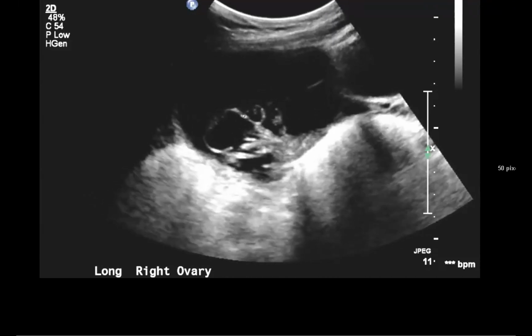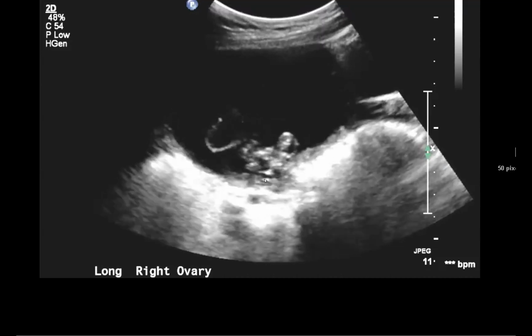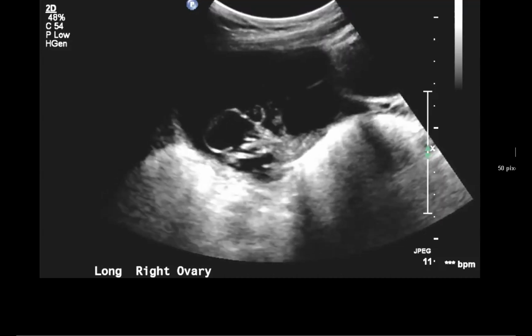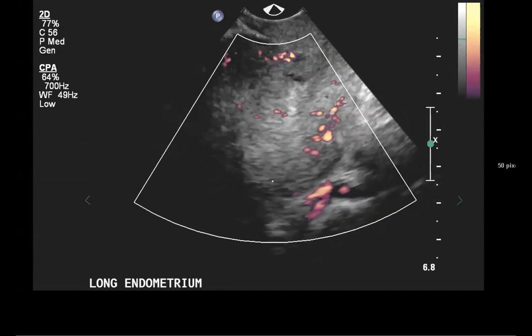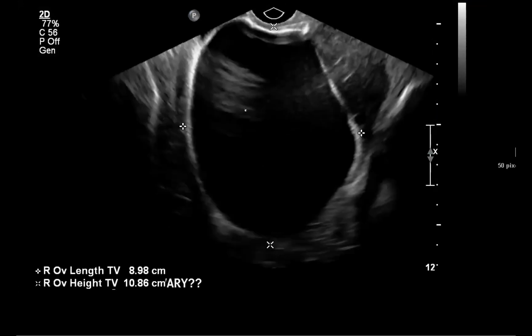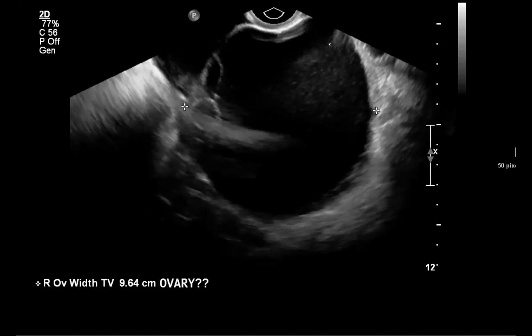Yeah, so I was thinking, all this big, solid, soft tissue component, and just going back to the other images, the two things I was thinking is, is this an epithelial neoplasm with malignant degeneration, or with all these homogeneous echoes, is this an endometrioma with malignant degeneration? Anyone else type anything into the chat? Borderline tumor. Okay, good thought. Anyone else?